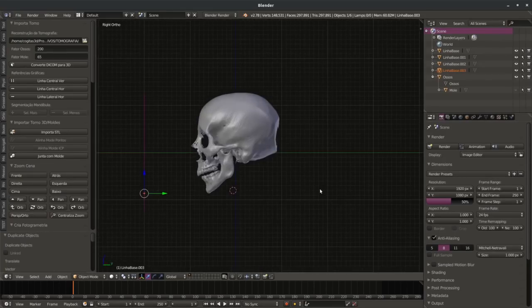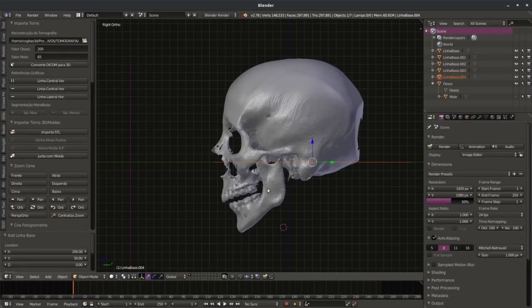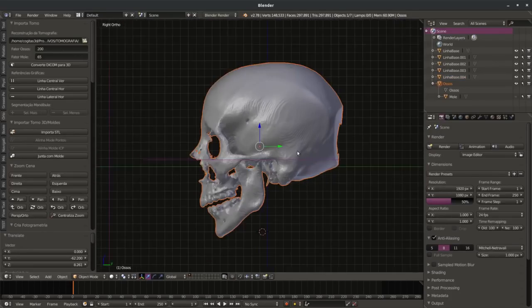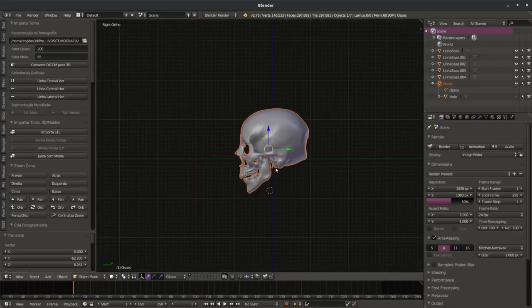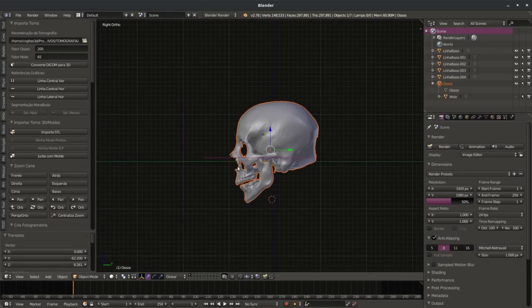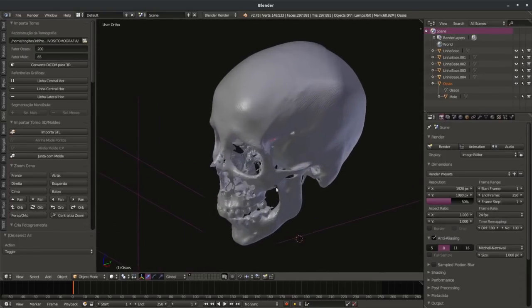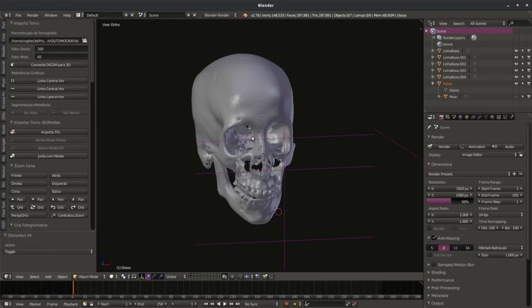And if you see from the right, you can put a lateral line. You can move the line. Here the skull already is in Frankfurt plane. We can see here, this is not necessary to rotate. So ready, we already have the bone rotated.